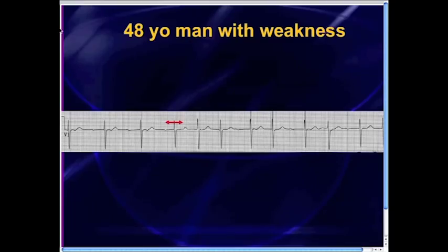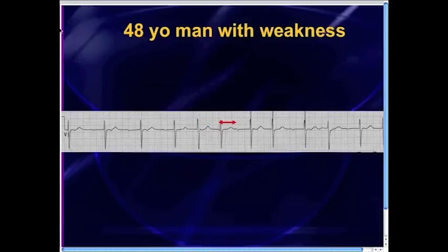It maps out all the way across these complexes, and it also reveals to us that that little junk right there is a P wave, and also that little blip right after the QRS complex is a blip as well, and that little blip right there before that QRS complex is a blip as well. You'll also notice, if you're going to try to figure out which P waves are going with which QRS complex, well, it's not necessarily that difficult. We can probably assume that this P wave goes with that QRS complex.